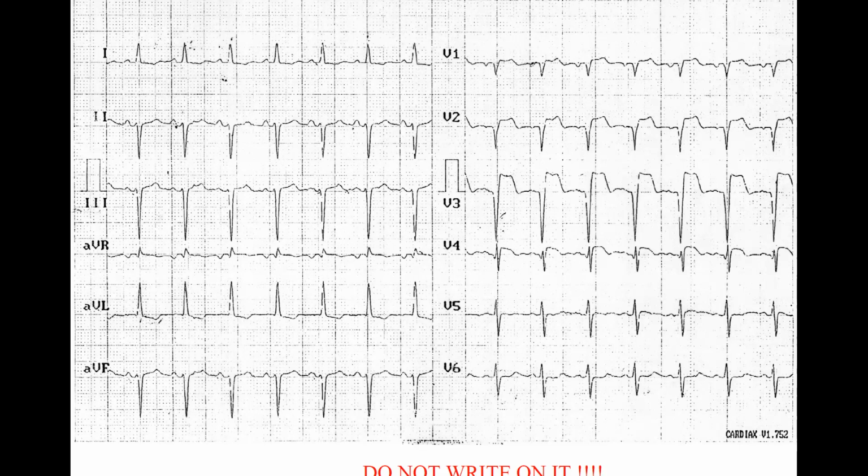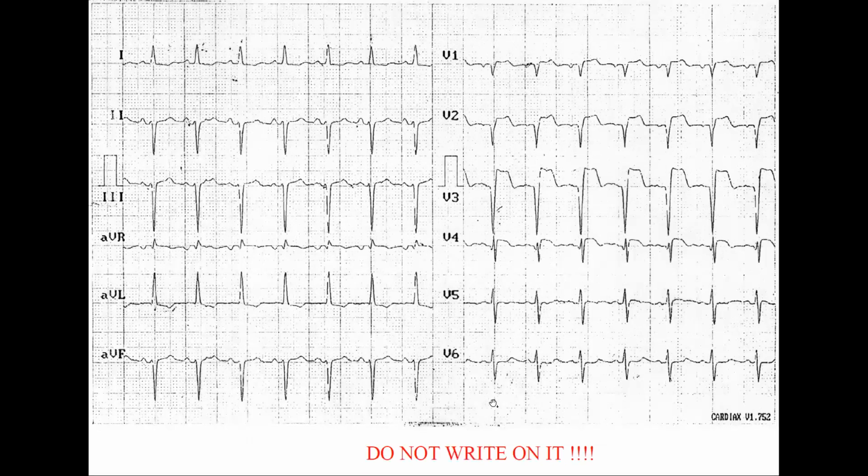Is it from the last lecture? Yes, but I told you to watch all the videos now. So that's a hypertrophy. This can be the sign of a right ventricular hypertrophy. It's true that in V1 you should see a tall R wave, but because we have an MI, that cannot be seen. So if I summarize, this patient has a sinus tachycardia, anterior hemiblock, anteroseptal acute myocardial infarction, and a right ventricular hypertrophy. Okay. Thank you. Good.